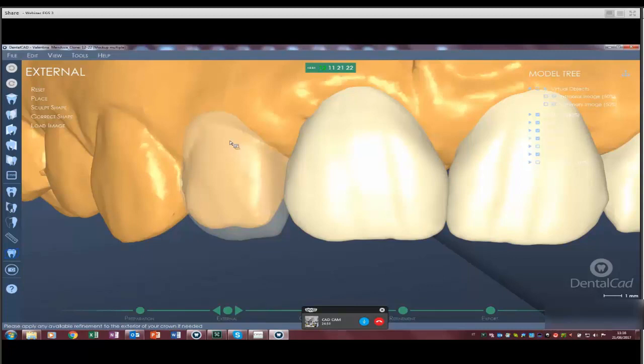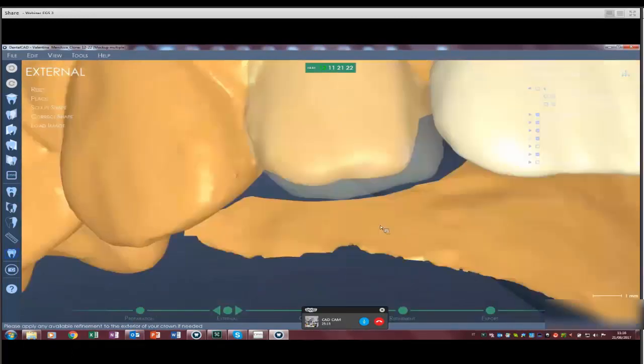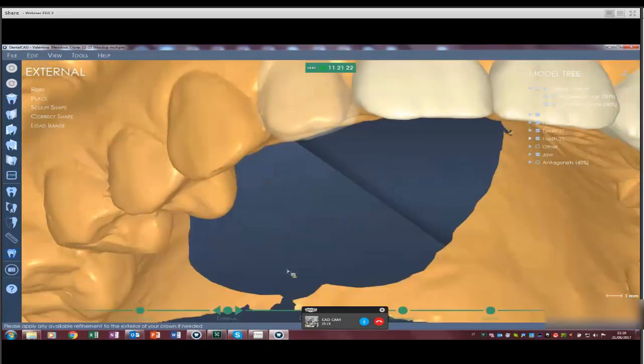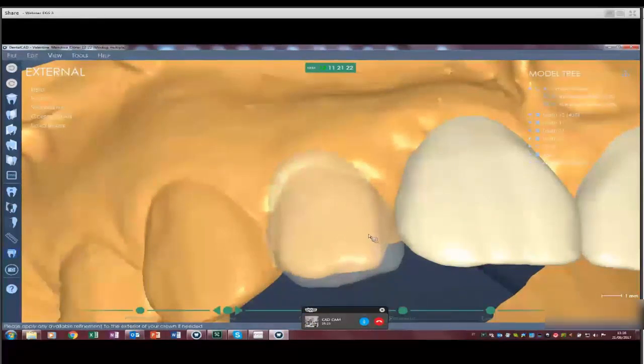And then I would like to focus on another kind of advantage that you can obtain by seeing this kind of opacity, this kind of transparency. Let's assume that you, as a dental technician, send to a dentist a screenshot of this situation. In this way, the dentist will be able to see how much of the tooth has to be prepared and how much has to be saved. So, there are so many different advantages that you can obtain by using this kind of protocol.